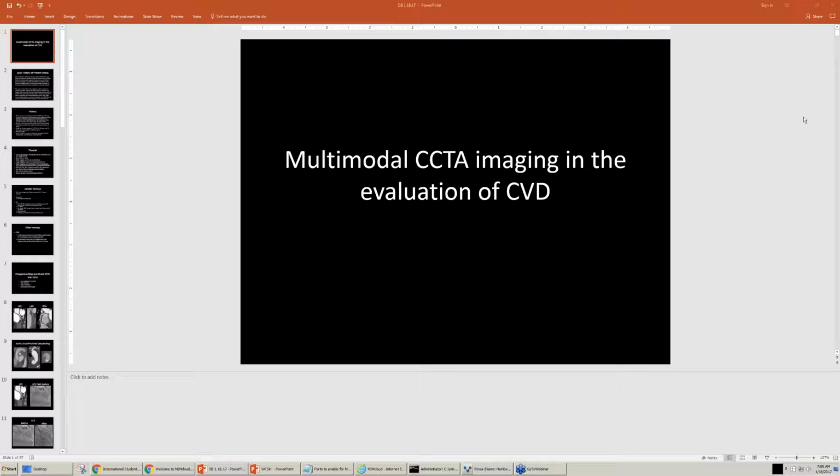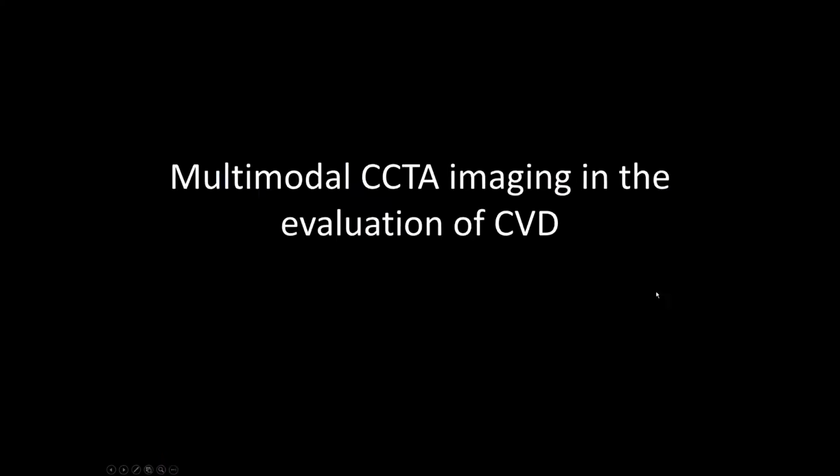All right. Good morning, everyone. I hope you guys are having a good start to the day. Let's get started. So Dr. Morales already mentioned there's a lot of imaging in this case. And what I want you guys to focus on is basically the use of different types of CCTA imaging and how it helped us in the diagnosis of the disease in this patient and how that helped us in the management of it. So let me just put this full screen.